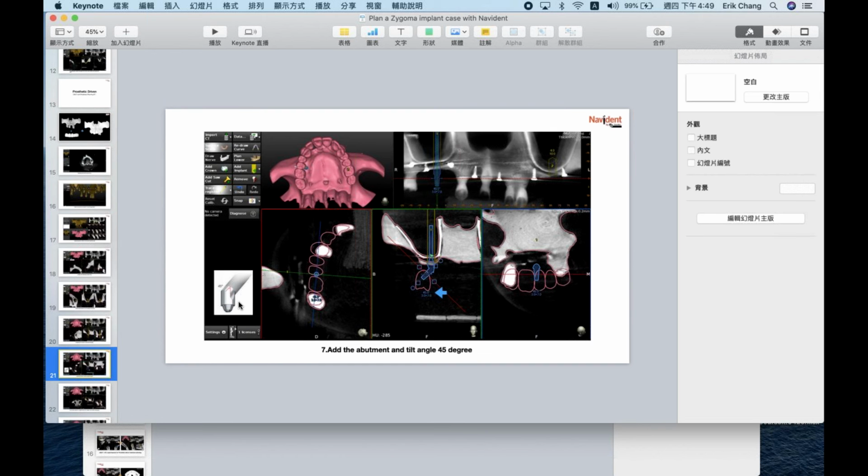Because when I try to make sure where the occlusal is, meaning where the abutment comes up, you have to know it from the occlusal view, right? Yep. And if you have the CT here, you will see too much information, maybe the lower jaw. Okay, good. I see what you're saying.